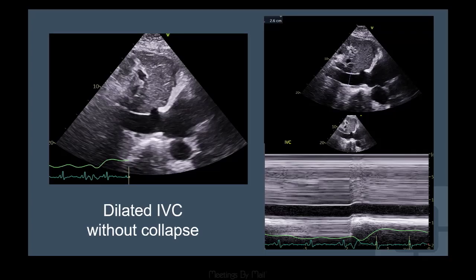So the other point would be the hot septum. That's how we did this. So basically, the lateral wall is sort of stuck. The pericardium is sort of stuck to the myocardium. So the anterolateral wall is sort of decreased in mechanical function, compared to the septum, which is still preserved, so that's why you call it hot septum versus the lateral wall. The lateral wall is sort of tethered because of the pericardial myocardial dysfunction, and the septum is preserved.